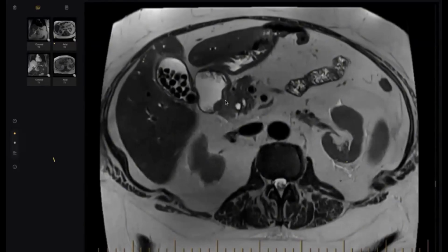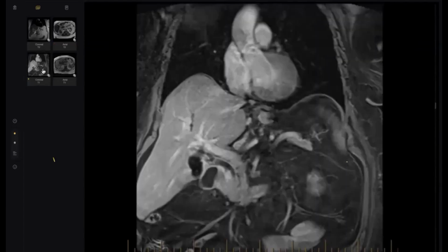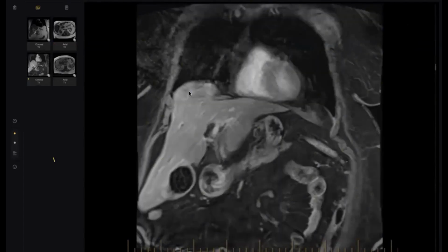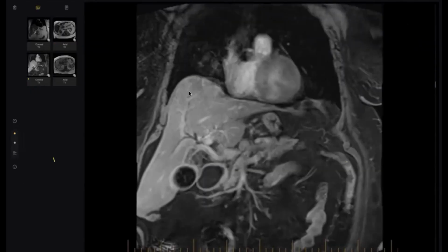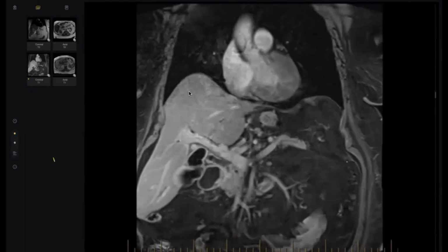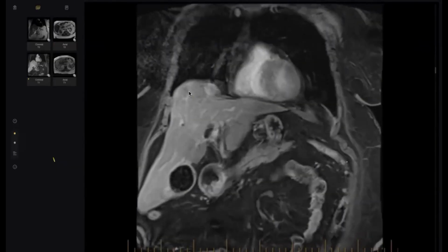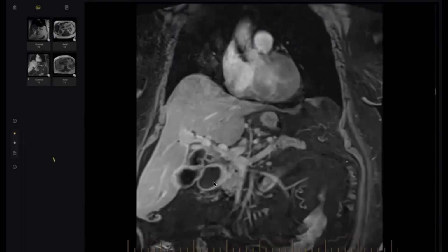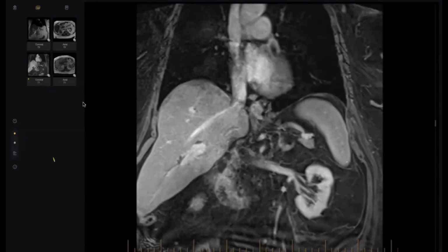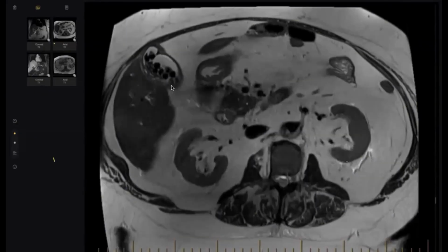By the way, to be fair, this case should be shown with contrast, and in axial and coronal planes. Even here, it's not clear. I tried many times. Okay, it may be this one. No, this is the first part, maybe, but it is better to be examined in all planes post contrast. Anyway, and the diffusion, by the way. Anyway, at least, thank you, doctor, so much.